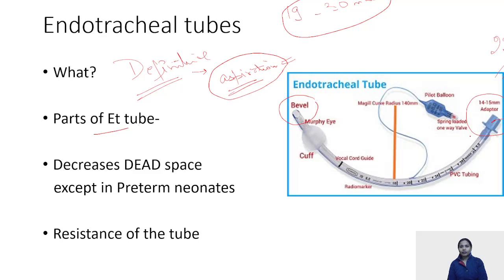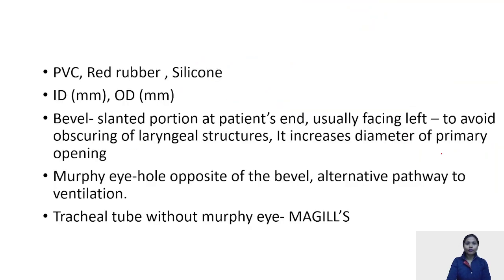From the connector, then we have this tube. It is made up of polyvinyl chloride. This tube has various markings on it, which tell us the depth of insertion, with the maximum number towards the machine end. Done.